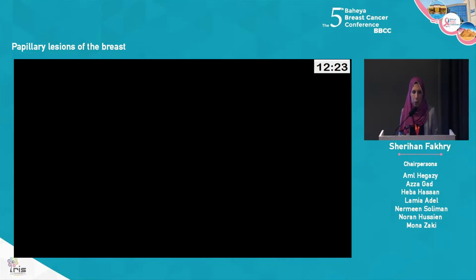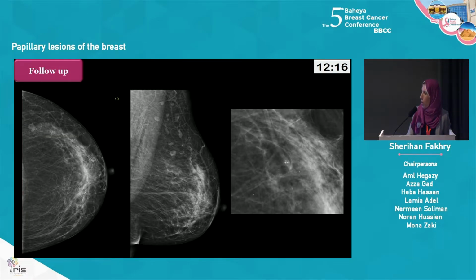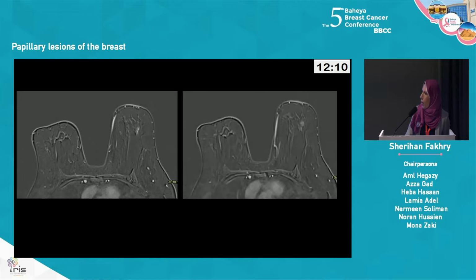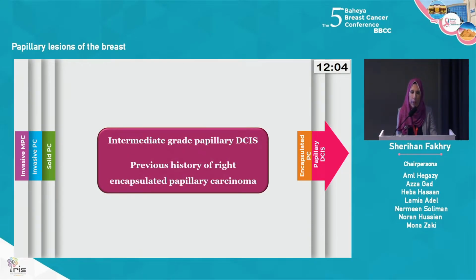There was no invasion. On follow-up of this case, there was a newly developed cluster of microcalcification on the left side that showed nodular and linear non-mass enhancement on MRI, and the pathology revealed intermediate grade papillary DCIS.